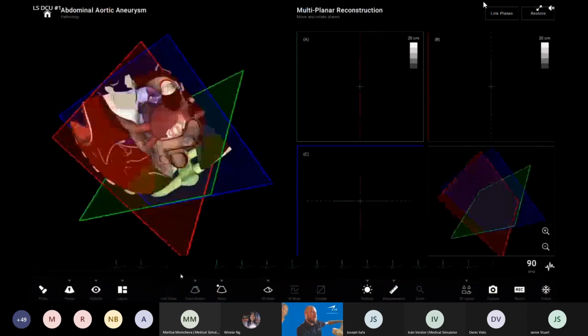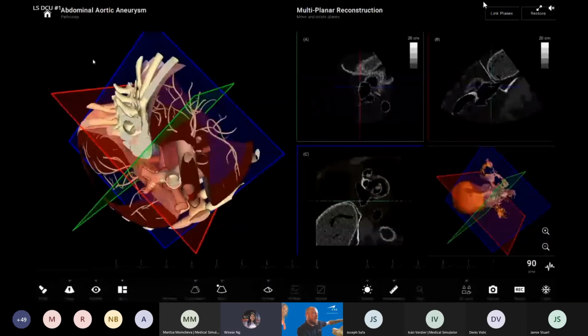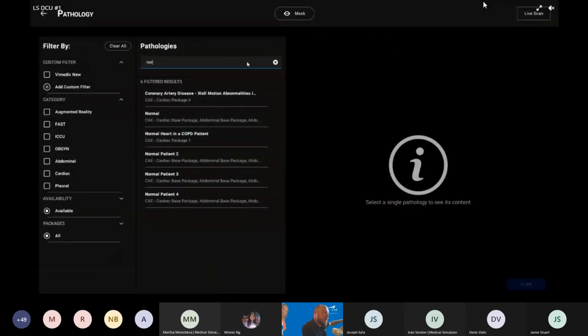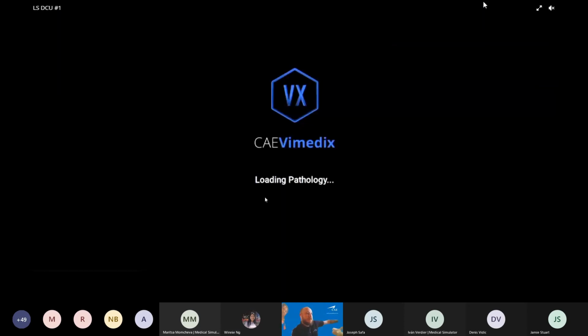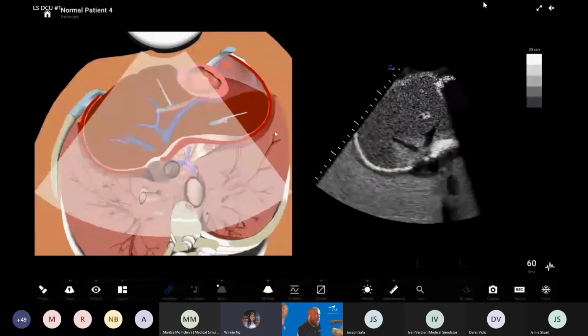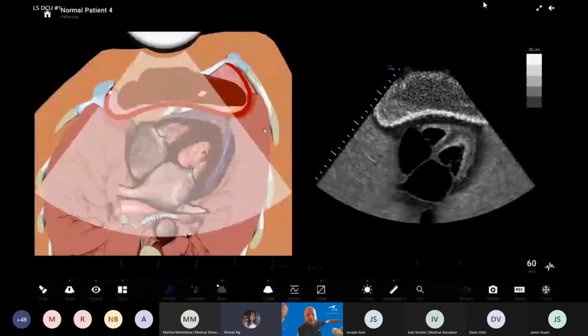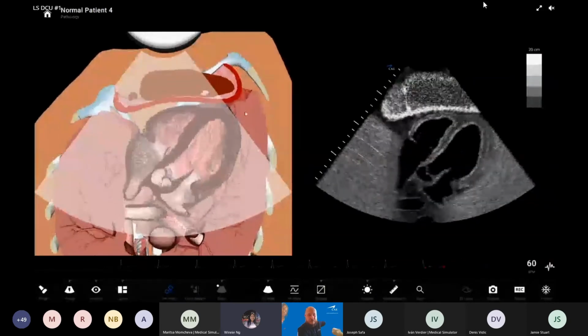Okay. So here we go. You go to normal patient 4. Let's get to our new pathology. Let's load it. So what Eric is showing right now is, if you're facing HeartWorks specifications, especially in the tender, they always use that they do have 130 intracardiac structures to look into cardiac details.